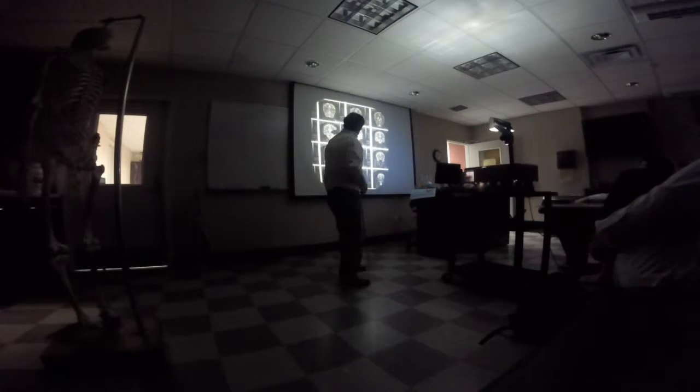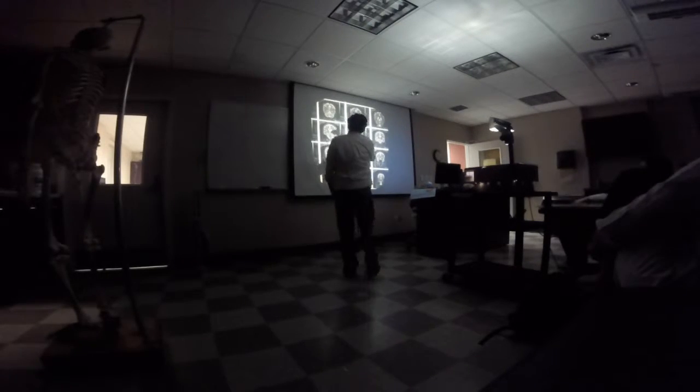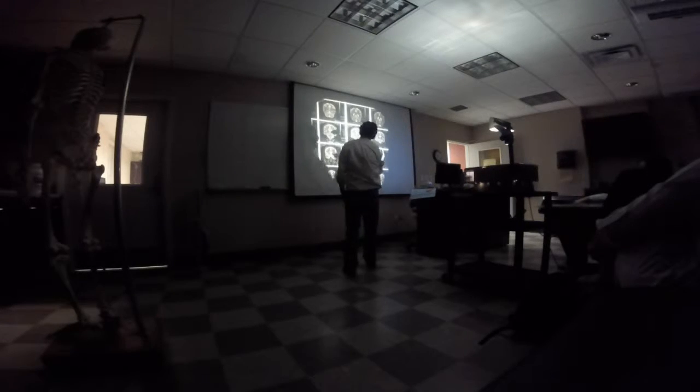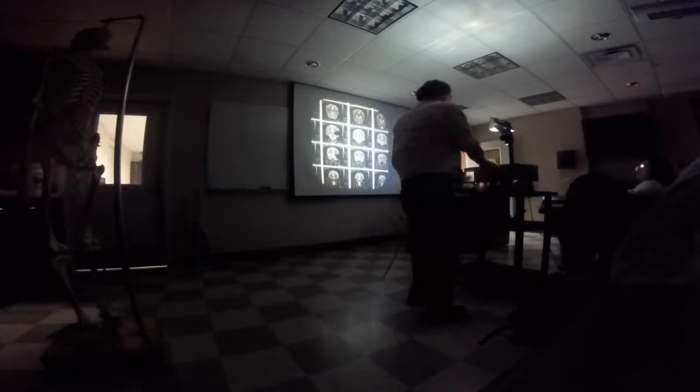Is the light part coming down from the lateral ventricles in some of the views, like in the middle, part of the cerebral aqueduct? Let's see, where? The middle second row. Here? Yeah. You mean right here? Uh-huh. I don't know what that is. I can't tell. It's not as discrete as you'd like to see.